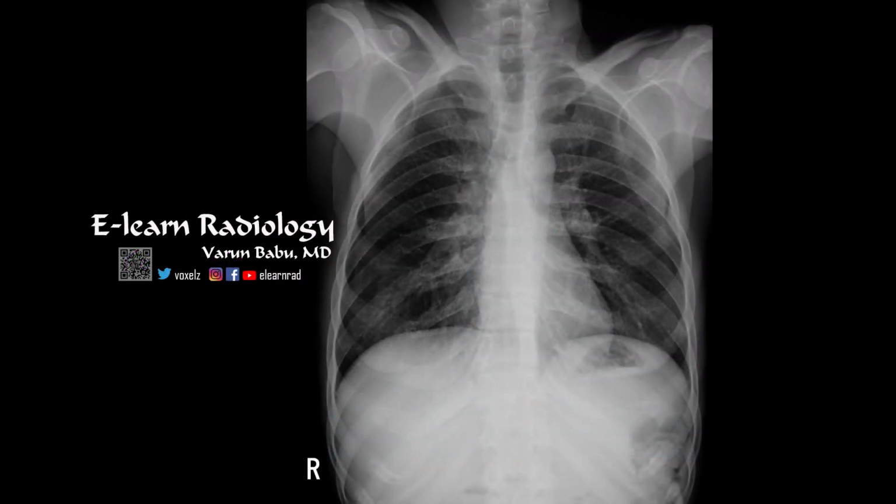So with the small checklist, we will actually be able to start reading a chest radiograph and make sure that we do not miss out on any findings. In the next episode, we will learn how to identify structures in a normal chest radiograph.